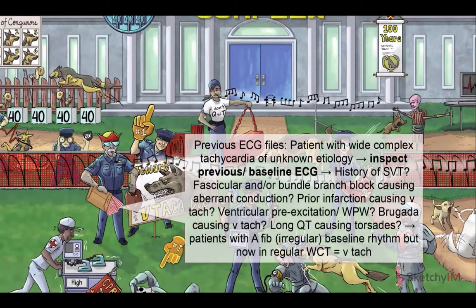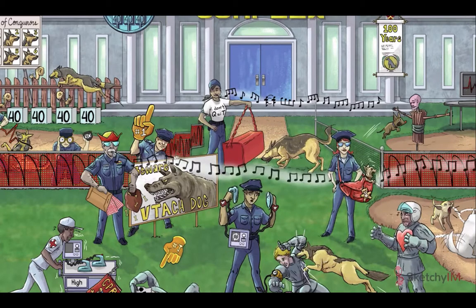All right, in the heat of the moment, we're now able to inspect the ECG and make a not necessarily definitive, but nonetheless educated diagnosis, differentiating between VTAC and SVT. Always remember, however, to check out a previous ECG if available. It might just give you that final clue you're looking for. We're going to be moving on to past medical history here, but I'll also briefly mention some corresponding findings from a previous ECG when applicable.